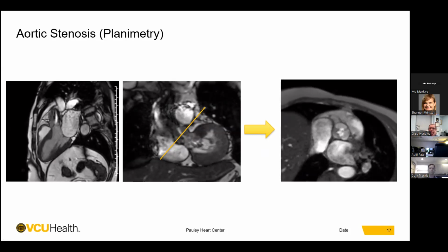from the turbulent flow, and it can be angulated, like in this case here, not as parallel to the aortic root as we expect it to be. So I try to obtain an image with another plane more parallel to the jet by placing my image line parallel to the jet core, like we see here. This line is, like we see here, and get a more aligned image to the valve.